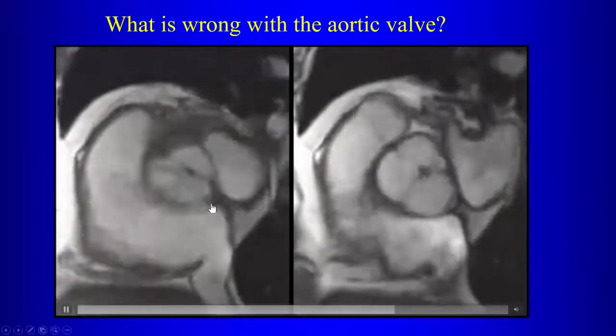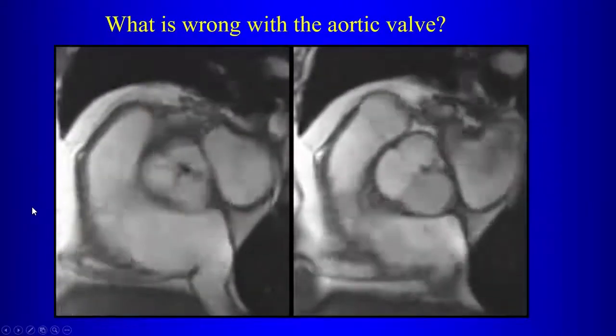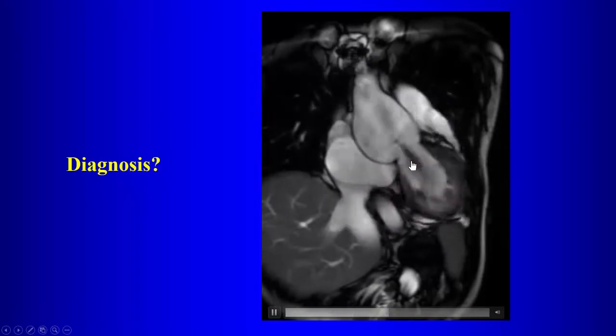And then when we examine the morphology of the aortic valve in this case, again, we see that this is a bicuspid valve, resulting in both aortic valvular stenosis and regurgitation. Again, notice the dark signal areas on the valve, and these likely represent calcifications.